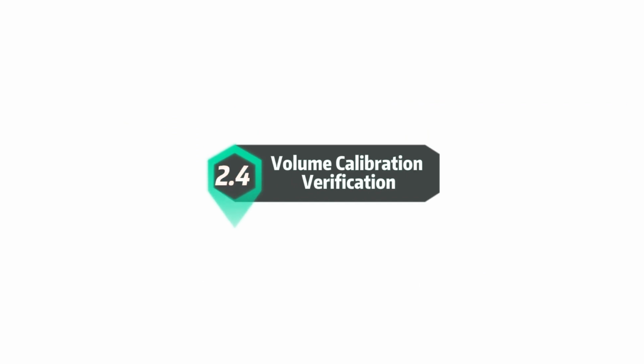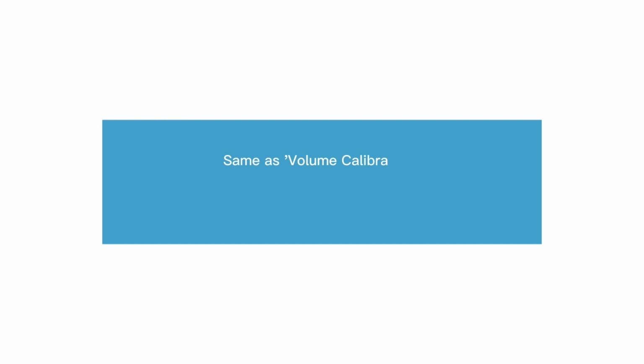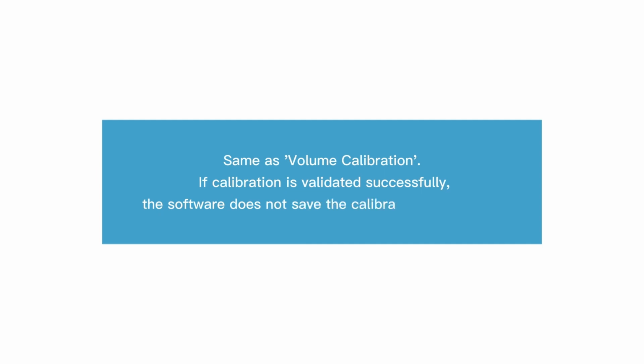Volume calibration verification. Same as volume calibration, but if the calibration is validated successfully, the software does not save the calibration coefficients.